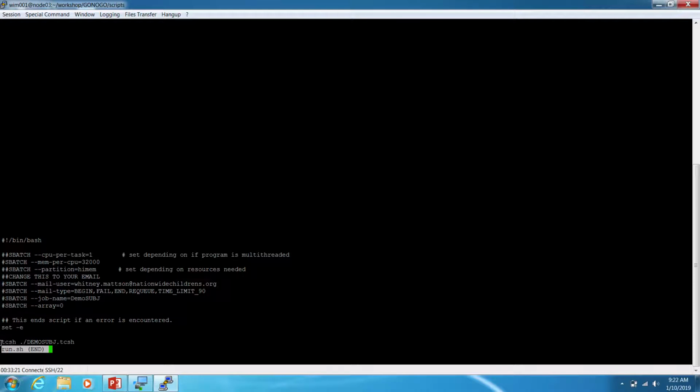Other than giving the cluster information about what type of job you want and how to notify you when it's done, all this script does is end up running that script that I just showed you.